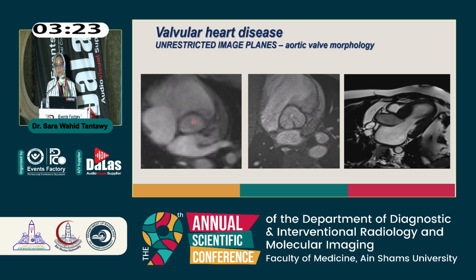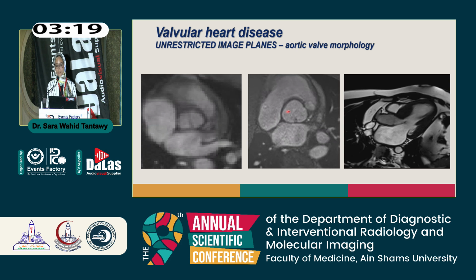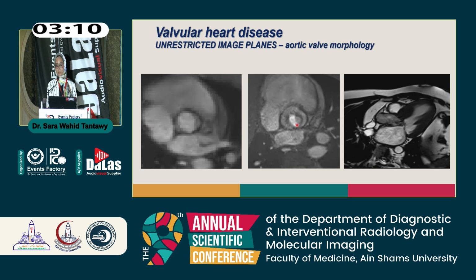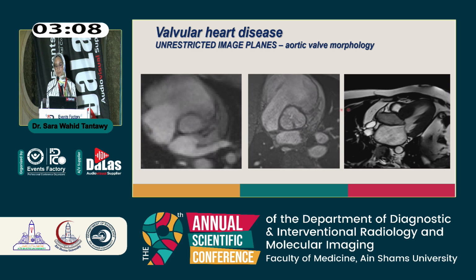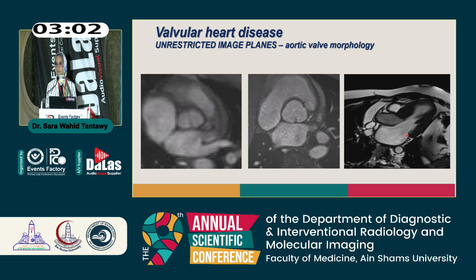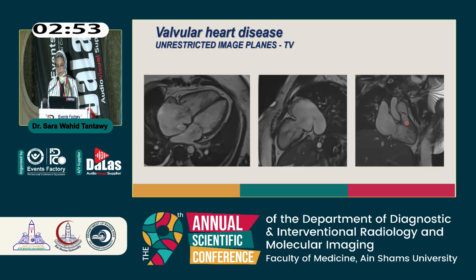For example, this case is a bicuspid aortic valve. This is a unicuspid aortic valve orifice where you can see that there is bicommissural fusion over there and bilateral or two raphes, which leaves the aortic valve orifice to have just a single orifice. And then you can also detect other sites of the stenosis, not just the valvular stenosis. You can have subvalvular stenosis, like cases of HOCM, which was previously demonstrated by my colleague Mona.